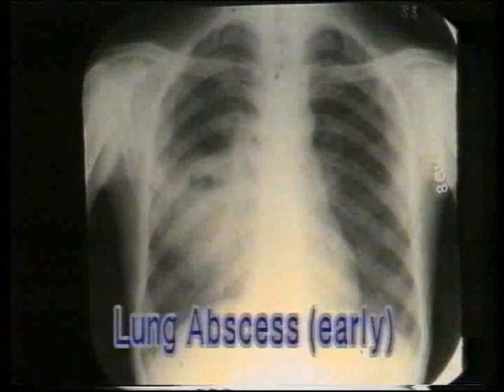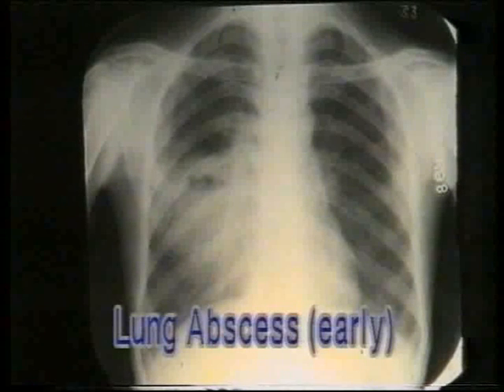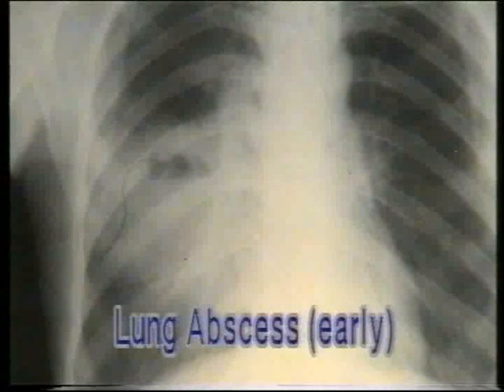A lung abscess develops in a patch of consolidation, that is pneumonia. So at the very onset, we have a patch of consolidation or there is a large segmental opacity without any fluid level. Then the characteristic air fluid level appears. Note the small air fluid level at the top of this patch of consolidation in the right middle lobe. This is an early lung abscess.